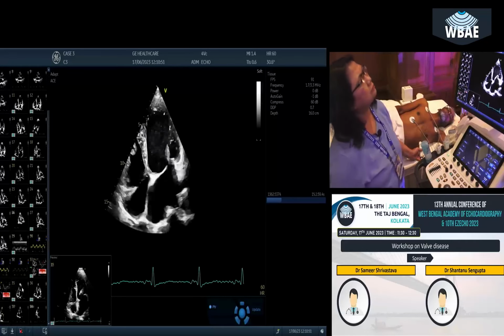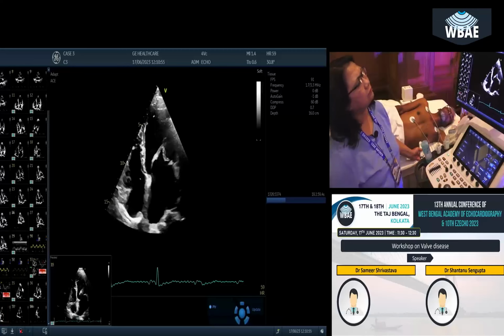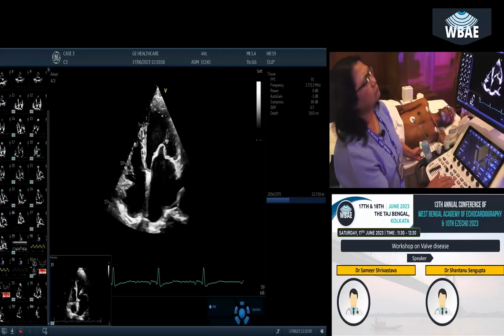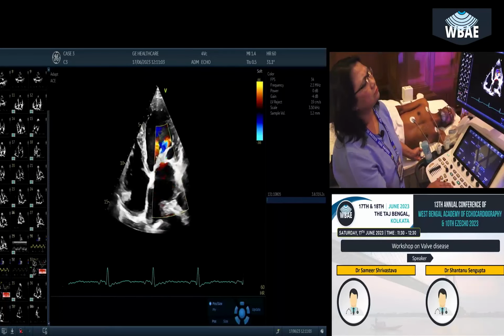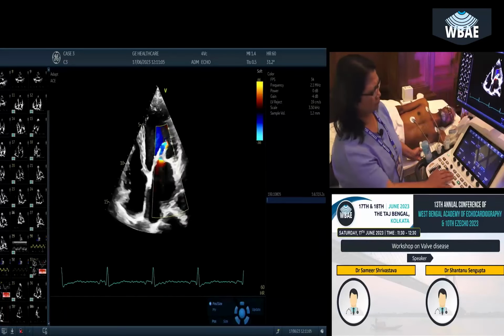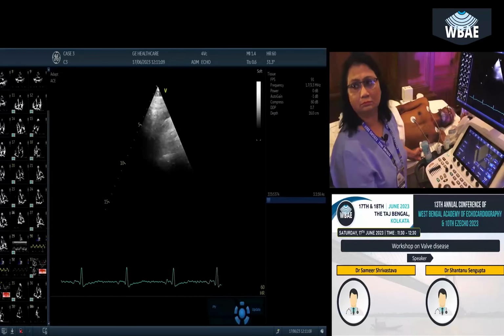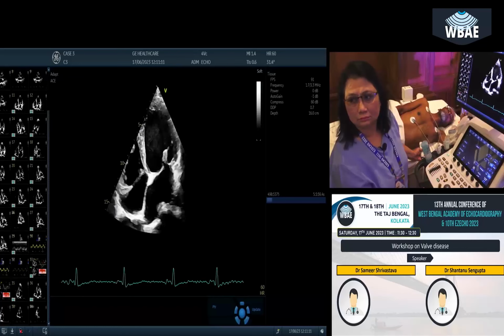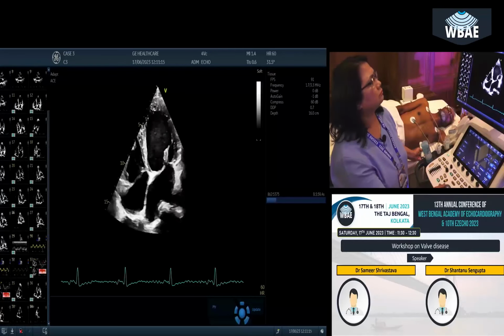Dimension here in 4-chamber view. You can measure the AP view and mediolateral views. It actually gives a rough idea. Mediolateral should not exceed 4, and the superior-inferior should not exceed 5. That is roughly 5 and 4, but there are no hard and fast rules that it can't be 5.2.